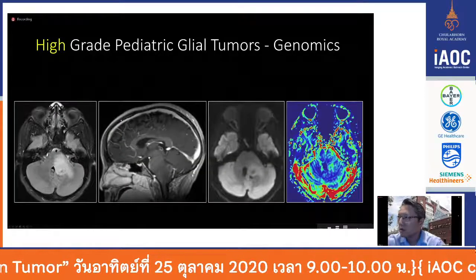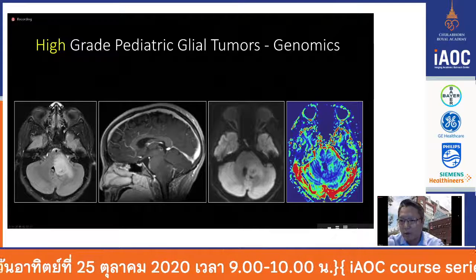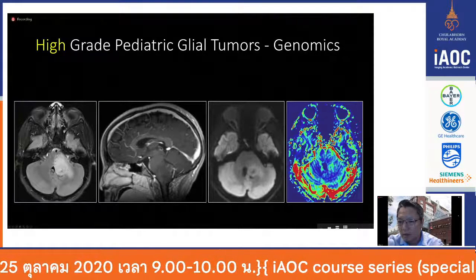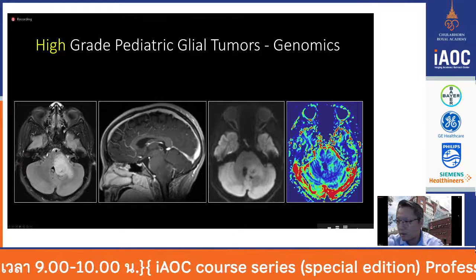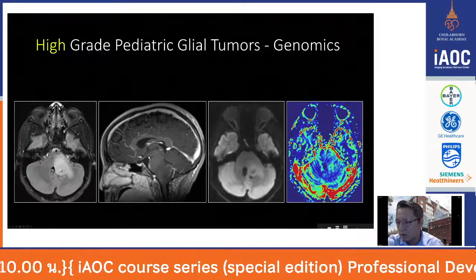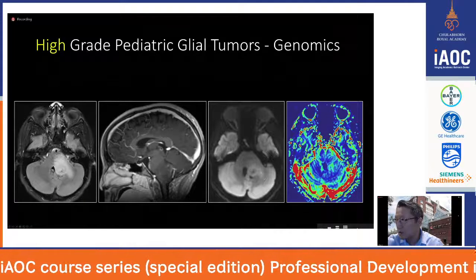Here's another case of a glial tumor, a little bit off midline this time. It's shifted away from the pons a little bit into the middle cerebellar peduncle. Even has a little pedunculation here, and into the deep cerebellar white matter here on the left. We can see this expands the dorsal pons as well as the medulla. It has a little bit of ring enhancement. Here's a B1000 image on diffusion.